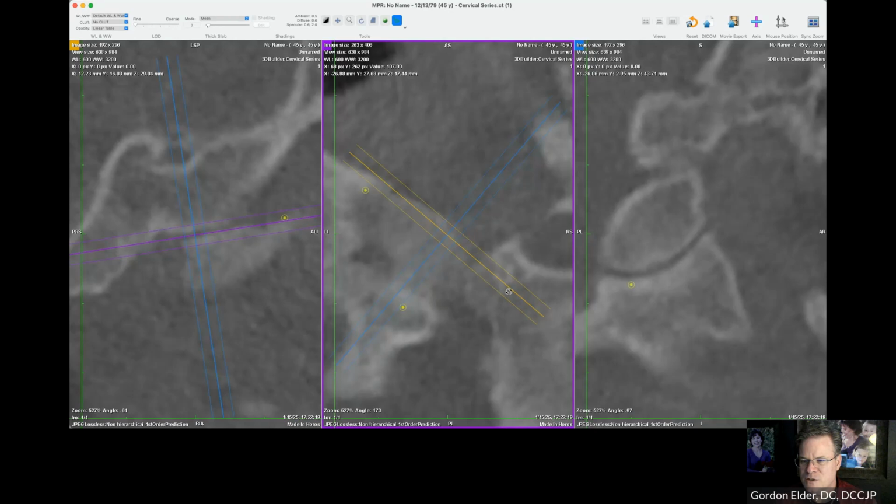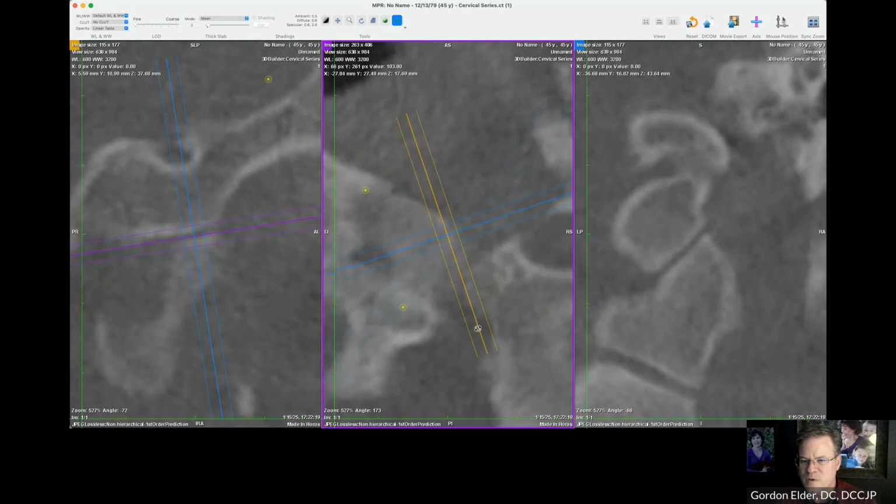We look at the lateral margin that's the furthest away, parallel, not just lateral, not straight lateral, it's lateral anterior, but we find that convergence angle, and then we go out laterally from that to the furthest point, and we look at that margin right there. So then if I have to go to a smaller and smaller slice angle, I can be pretty sure I'm right. So we're going to call this a PIL in the Blair system.